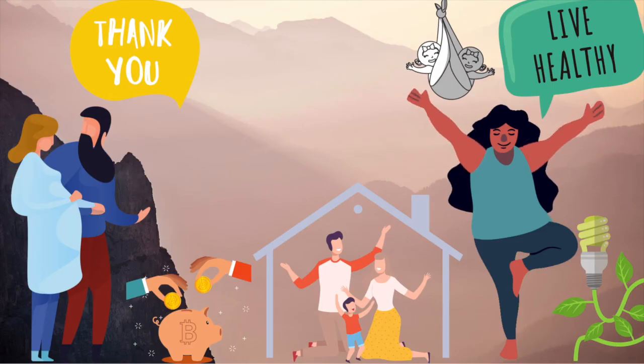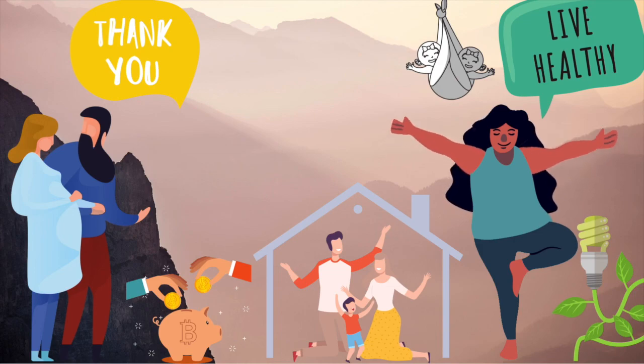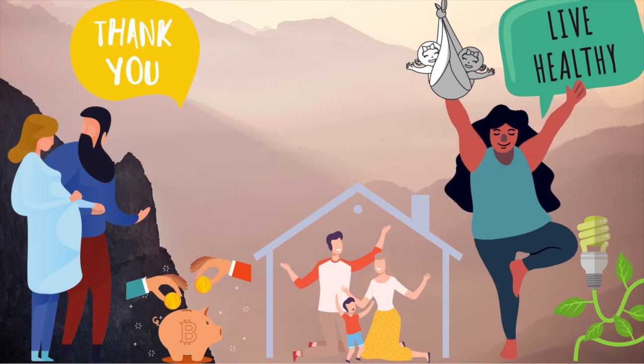The GDMApp has been designed to be an easy-to-use introduction to healthcare technology, and we hope that this will help improve the quality of life for women with gestational diabetes by saving their time, energy, and finances, and guiding them towards an improved lifestyle.